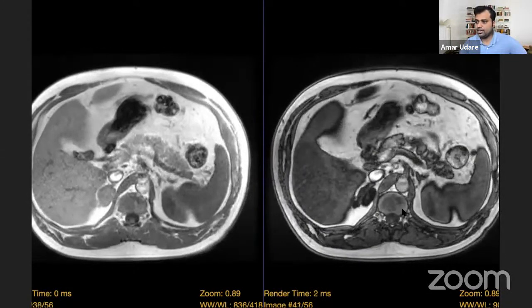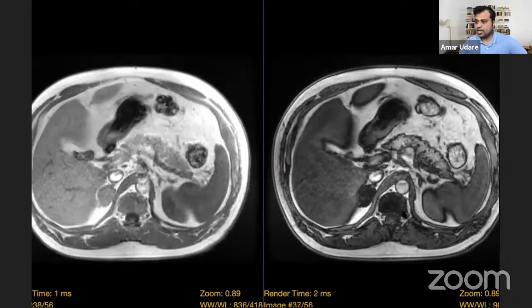There's this right adrenal lesion of fairly significant size. Now, what would you call it? Is it concerning, or is it a benign finding? So that's T1 opposed and in-phase images at the level of the right adrenal. All of you have rightly pointed out, the India ink artifact in the image on the right tells us that this is an opposed-phase image. Excellent. Zelda and Jishan, you've rightly pointed out.